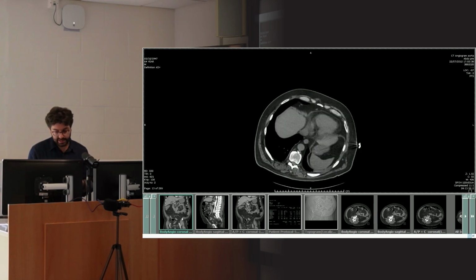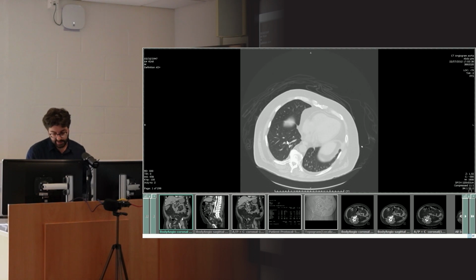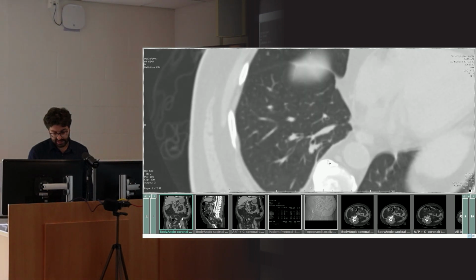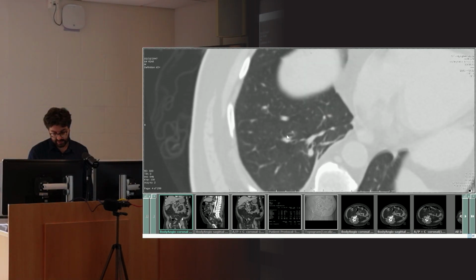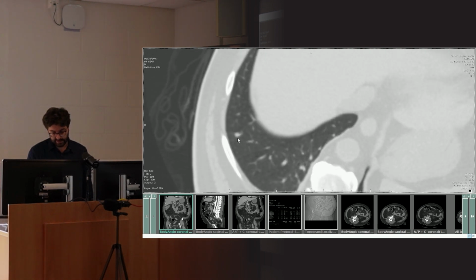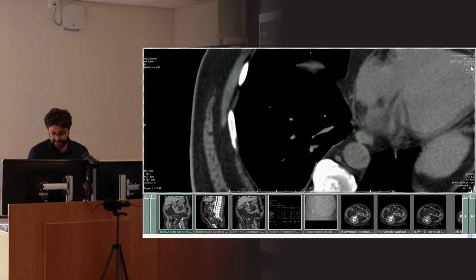And all of our grayscale is focused in on the soft tissue range. If we want to have a look at the lungs, we use a lung window. And so what I've done here is basically change the way that those Hounsfield unit values are converted into grays. So now you can see beautiful detail within the lungs. You can see all the vessels, you can see the bronchi and the bronchial walls here. And you can see the lung parenchyma. You can see if there are little nodules, like this tiny little thing here, for example. So you can then assess the lungs.